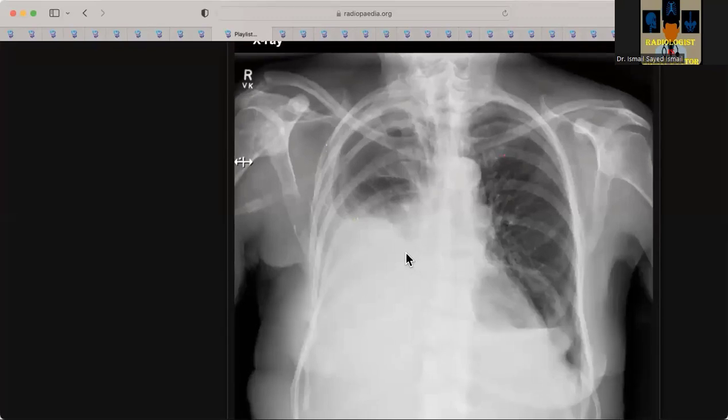This could be due to a metastatic deposit. There is no other metastatic deposit that could be seen within the visible bones. I cannot see any missing ribs within the available image. So to summarize my case, I have been presented with a chest radiograph for an adult patient with right hilar fullness associated with elevation of the right hemidiaphragm, which could represent phrenic nerve involvement or phrenic nerve palsy, associated with a metastatic deposit in the body of the right scapula. Can you tell us where the primary malignancy is from this chest radiograph?